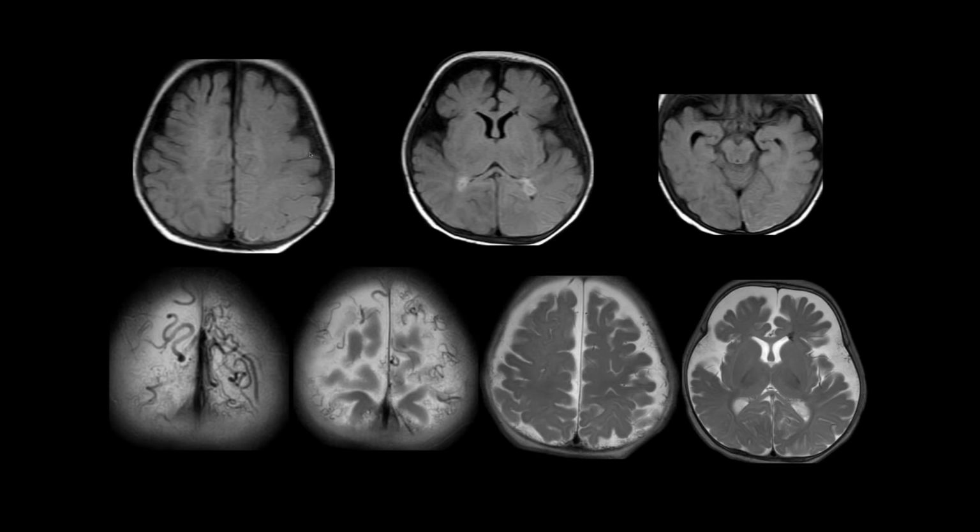So yeah, according to the neurologist here, I've asked them what exactly do they mean by neuroprotection, and they said aspirin. But of course, if they have seizures, then you might want to control those seizures, and you can see that on this T2 here, which Nihaal is showing below. There's already hypermyelination, accelerated myelination happening on the left compared to the right. So the axonal degeneration from the profuse seizures has led to this atrophy that we are picking up as well. So perhaps early intervention would be key in many of these cases.